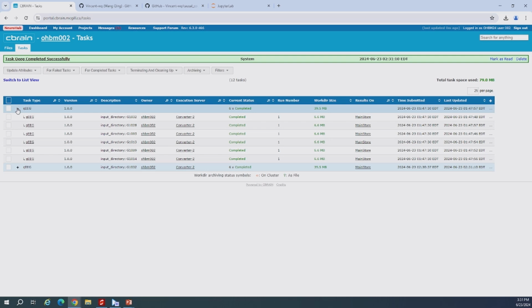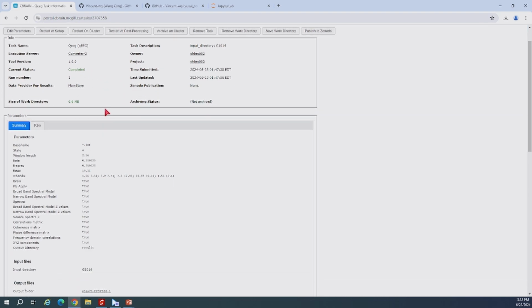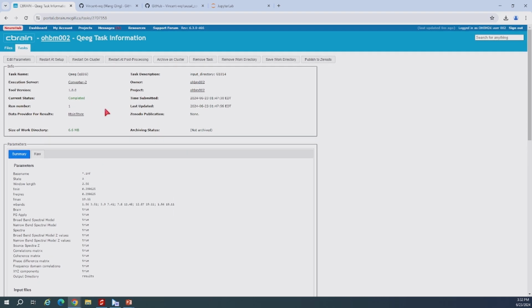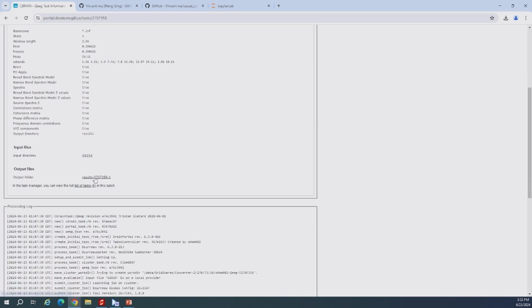Now we can go to either here or to files. So you will show here. Okay. Now we can see some of the files. We can see some of the results. We have implemented a very brief, very simple viewer here for just having a first look at the data, at the results.